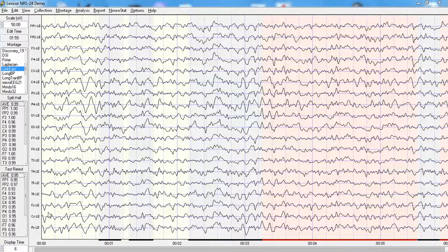This is a demonstration of the Applied Neuroscience Incorporated's effective connectivity module that is now inside of NeuroGuide, at least for the surface effective connectivity. Now, in functional neuroscience, there are three categories of connectivity. Category 1 is referred to as structural connectivity, such as what you see with a structural MRI.